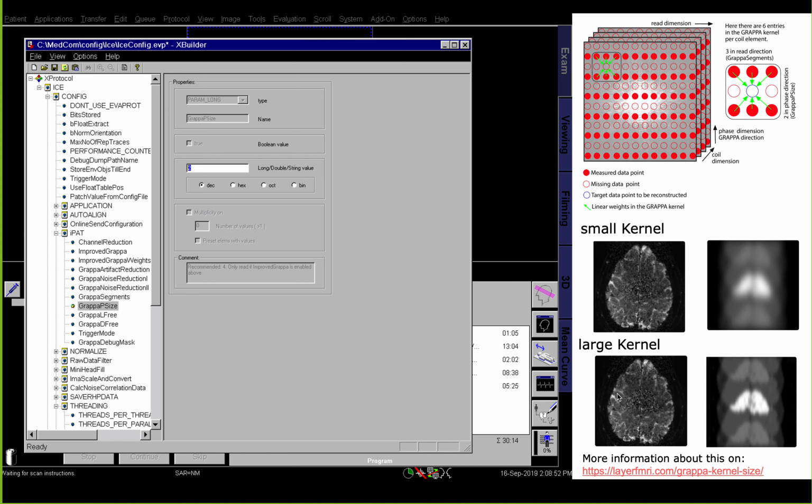So here this would be the hand knob that I'm interested in. If I'm interested in that area, I might want to use a large kernel, because then I keep all the high noise level in the center part of the brain, and the noise doesn't leak out to the motor cortex.